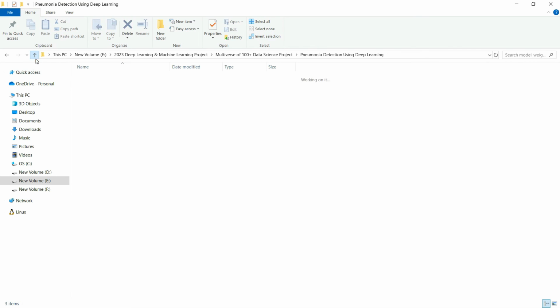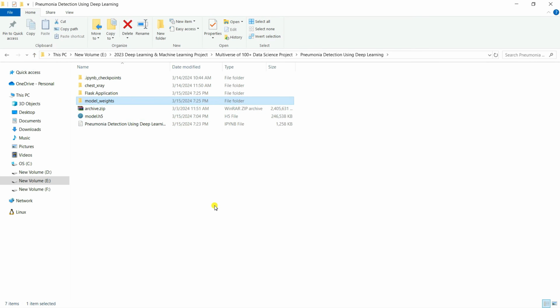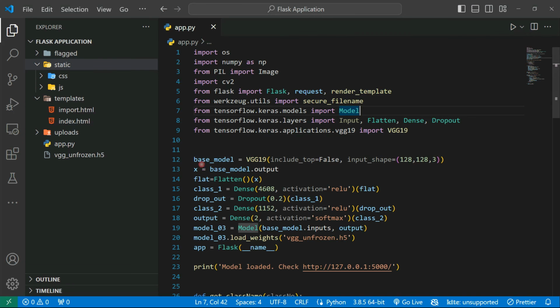Okay, so this is nothing but after 35 epochs in Google Colab, it will take maybe 2 to 3 hours to train the model. I got 93% accuracy, which one is not so bad. It's really very good. So what I can do, I'm simply going to use this one and try creating the web application. Okay, so see what is actually happening here.